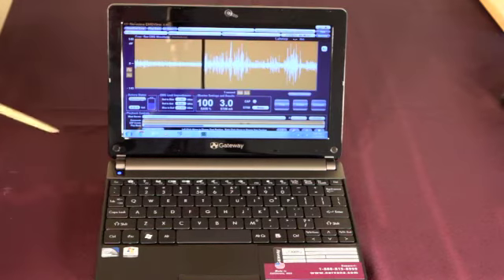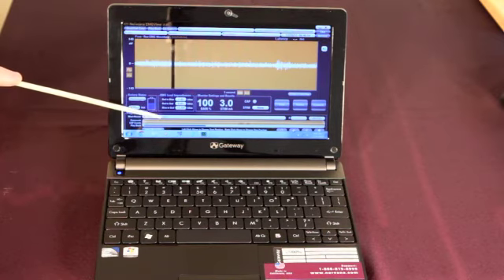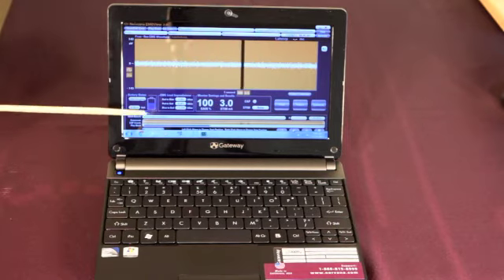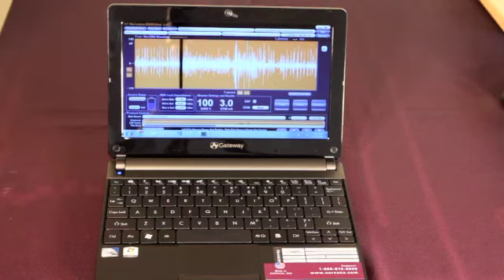Below that, we have an indicator bar that's labeled comments that tells you with little marks, either black or white, where the comments occurred during the case. The white marks are text comments, and the black lines or marks indicate that the test button of the Nirvana was depressed. That's often a nice way to mark a significant event, is to just press the test button, and that'll leave a black mark along the playback timeline.